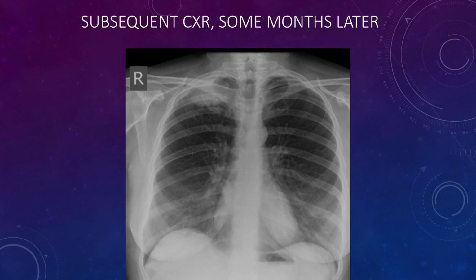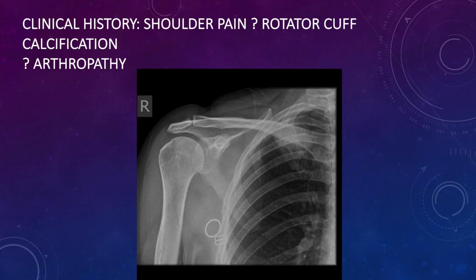Okay. So this patient then came back a few months later, still complaining of pain. So go back to your AP shoulder. There's your lung mass, hidden behind. They reported it as no features of rotator cuff calcification, mild degenerative change, slight downsloping of the acromion, and so on. Beautiful report for an AP shoulder, but this unfortunately was missed. This patient came, I think it was about 3 months later, with a large apical tumour.